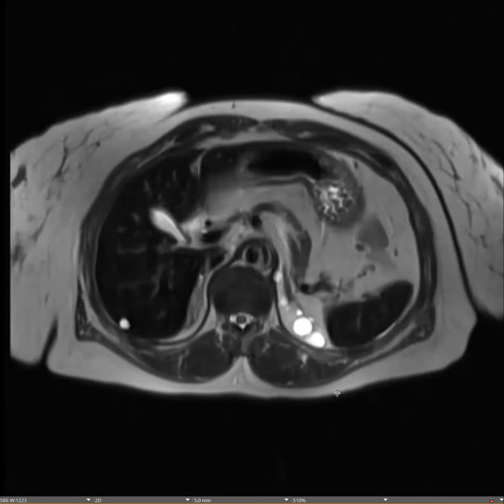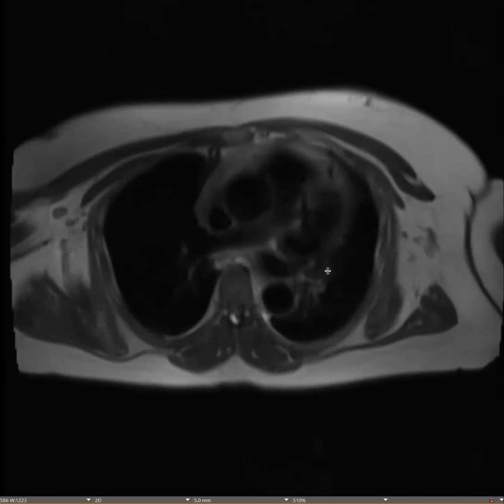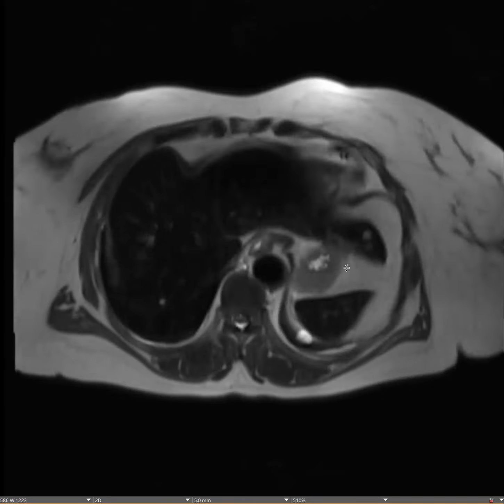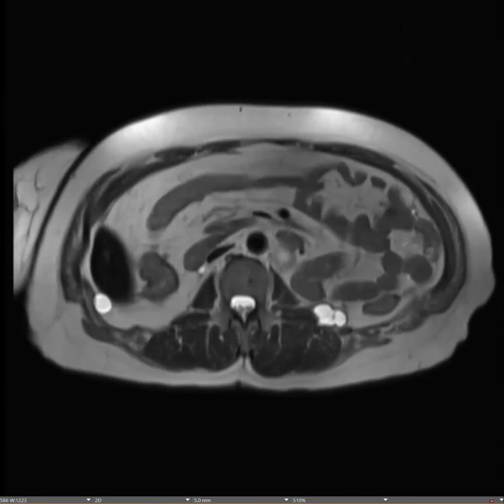None of the lesions enhanced. Everything was cystic, but it's been growing. That's what makes it more suspicious, because over time it's slowly, gradually increasing in size and number as well. So we said if they can't get to the retroperitoneum, at least EGD-wise they can get a sample of this one lesion if they could. I don't know if they can see it. It looks like it's in the wall. I don't know if they can visualize them, but this looked really weird.